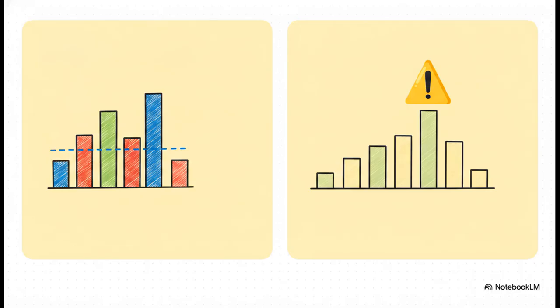When you're looking at that generated PDF, you're going to want to pay really close attention to a couple of vital metrics. The median error gives you the general baseline error calculated across all of the leaves. Meanwhile, the maximum leaf error is going to pinpoint the absolute worst performing individual leaf in the entire delivery. If you keep an eye on these alongside the error histogram, you're going to be able to spot systemic drifts way early, long before they turn into real clinical headaches.